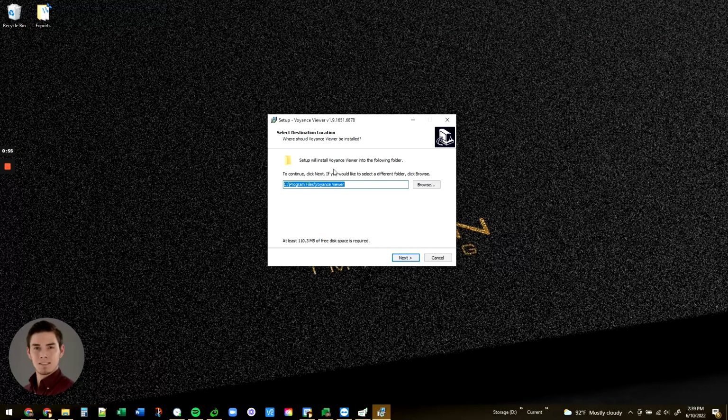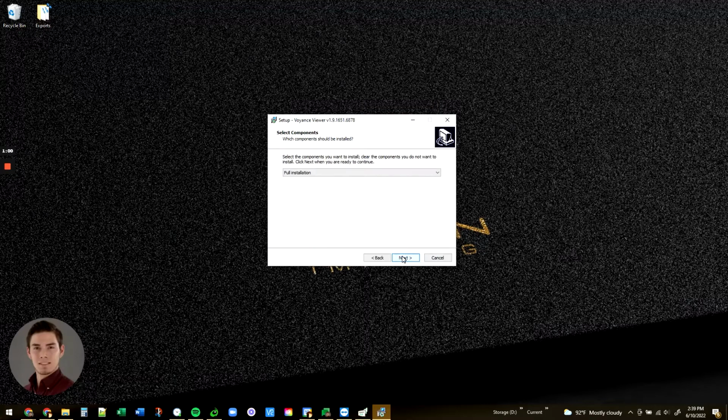So all the default options here are going to be best utilized, so just click Next, Next, Next, Next, and Install.